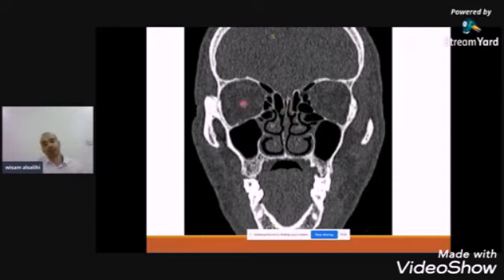This section is very important. Here we see the nipple of Kennedy between the superior oblique and medial rectus muscle, from which the anterior ethmoidal artery emerges from its origin to the septum.